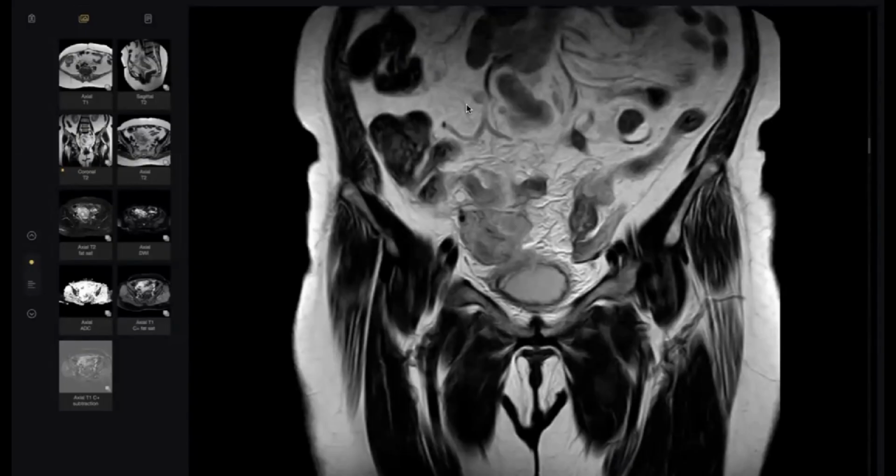So this can be a case of acute appendicitis, because in this location there are two possibilities: either adnexal pathology or appendicitis with periappendiceal abscess. So this is a local abscess here. There is a perforation. What will you do next?